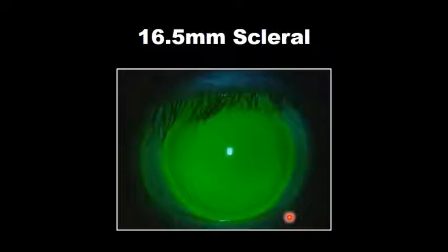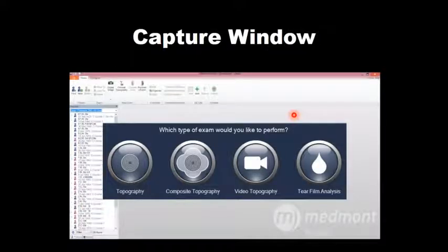I feel that I am far more efficient using the contact lens module than by using the diagnostic set. And it makes sense because we can put on a lens, we can alter the fit in this digital environment that takes us literally seconds to steepen or flatten the base curve, to increase or decrease the diameter. In the amount of time that we can model what might be the best possible fit in this contact lens software, I can't even finish cleaning the lens and placing one single lens on eye. So it's a very efficient tool in contact lens practice.